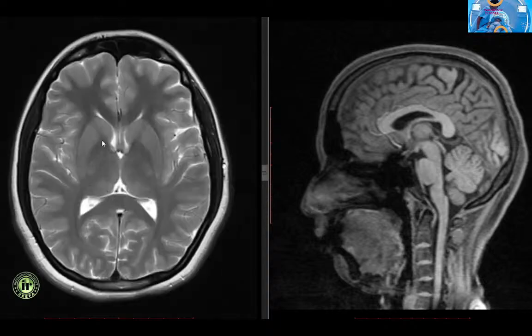The tail of the caudate nucleus lies above the temporal horn of the lateral ventricle and is not readily identified on MRI images. The lentiform nucleus is divided into two by a sheet of white matter into a smaller medial component which is called the globus pallidus and a larger lateral component called the putamen. The caudate and the lentiform nuclei are together known as the corpus striatum.